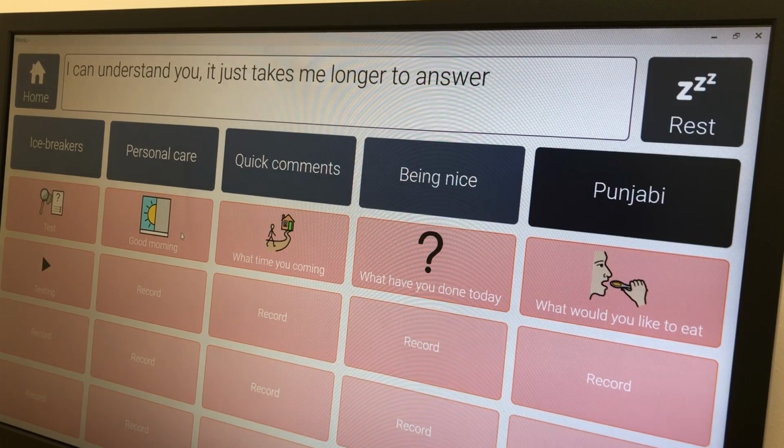So if I give you an example, if I click on good morning, it speaks out the message of a pre-recorded message that we'd recorded with her husband.